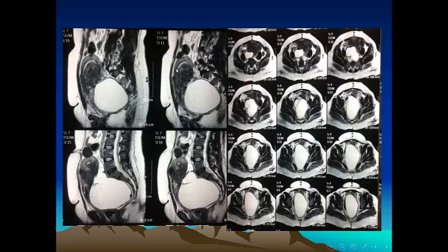So this is focal adenomyosis of the posterior wall of the uterus, and note the difference from the anterior interstitial leiomyoma. And there is also a subserous leiomyoma here. But we have also other features of endometriosis. We have a large pelvic endometrioma reaching to the sacrum posteriorly, and it was bright on T1, features of endometriosis.